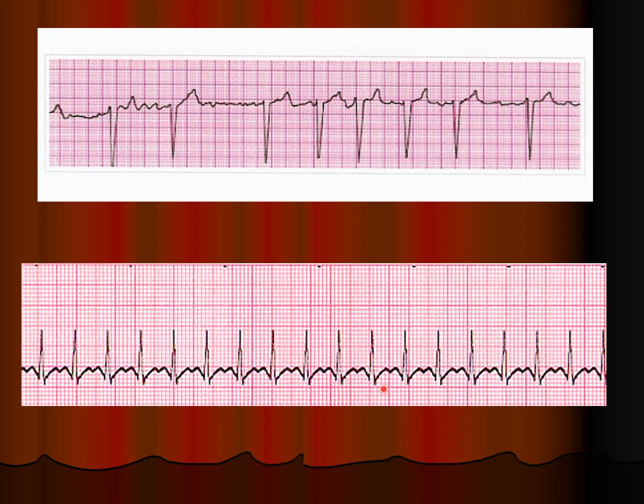You get tempted. You're like, oh, well, I have a pretty little upright P wave, and I have a skinny QRS, and I have a T wave, so that means it's sinus. Don't go there. It is above 150, and for our intents and purposes, if it's above 150, we're going to call that a supraventricular tachycardia.